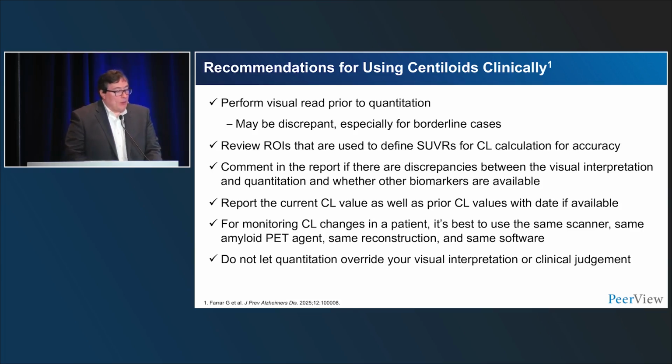And finally, I think this is true throughout imaging. It's certainly true in nuclear medicine. Quantitation is very useful, but don't let it override your clinical judgment. Especially as you gain confidence with visual interpretation, you will find cases that are true positive that are negative on quantitation. Again, I'll show you some examples, but don't be afraid of that discrepancy. Look into it, try to make sure it's not a technical error, make sure that you're confident in your read, but don't be afraid to override the quantitation if you're confident in your visual read.